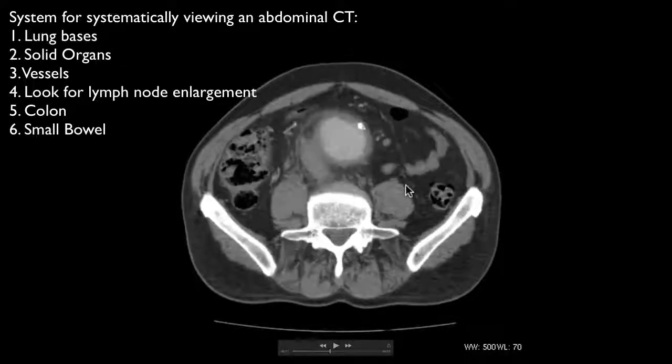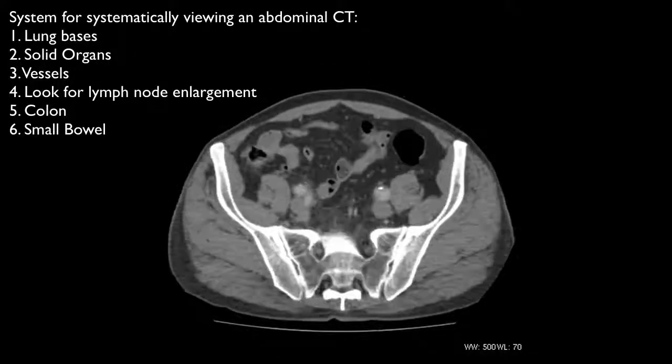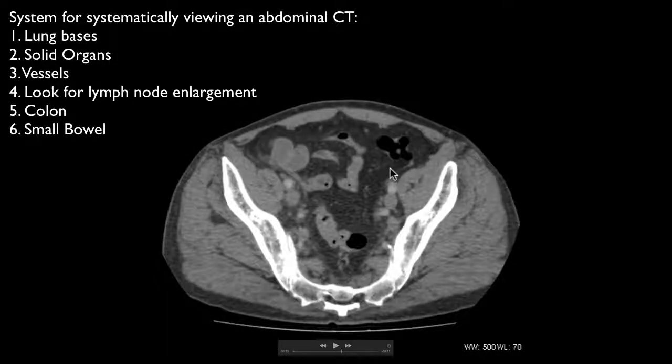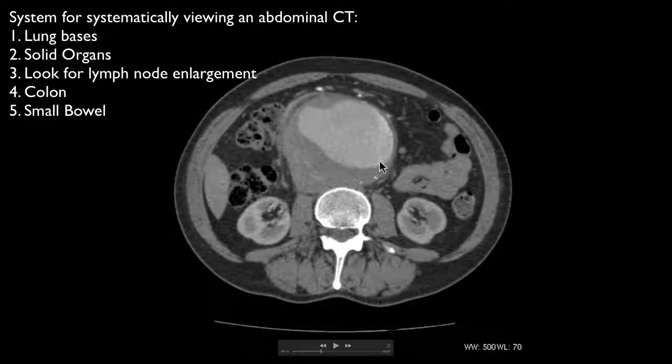And if you're looking at that specifically, you'd have some oral contrast. Yeah, so if you're particularly looking for small bowel pathology, there are various ways of investigating that. You can give oral contrast for CT, and if you get good small bowel distension, you can get really nice pictures for the CT.